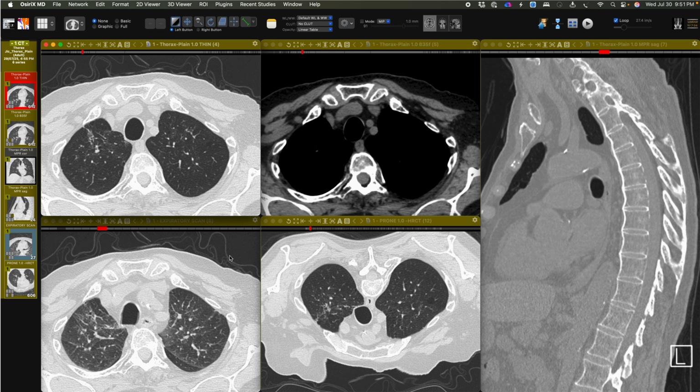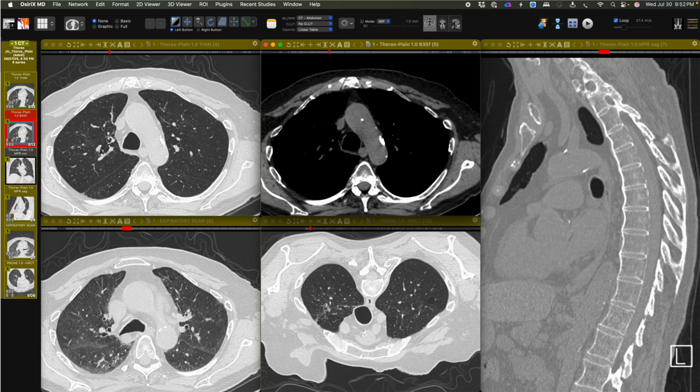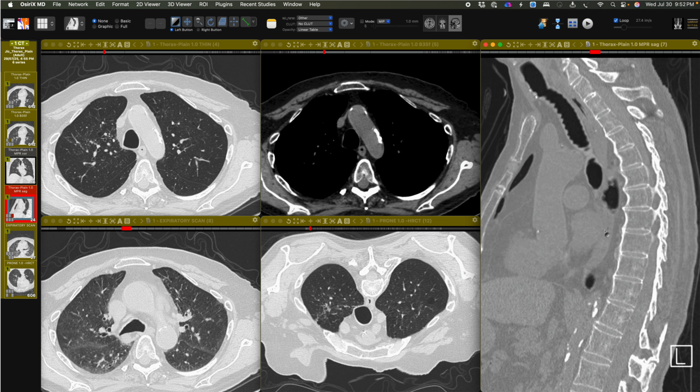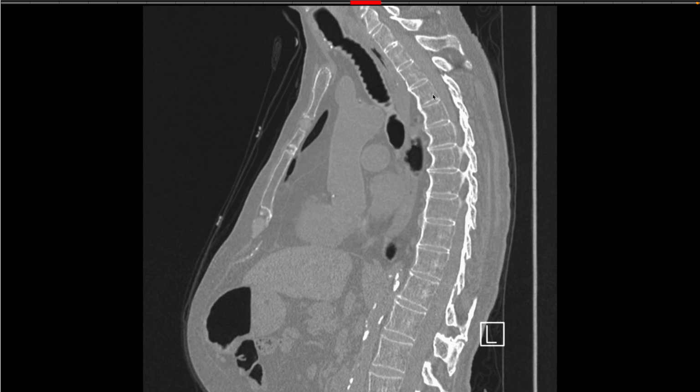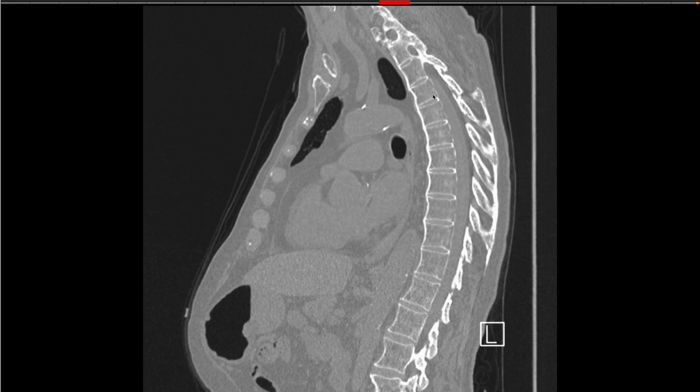And so here is how I open up my scans. You see the volume inspiratory on the left, and you have the soft tissue, then the expiratory, then the prone images, and then the sagittal spine, all of which are opened up together. The sagittal spine shows ALL ossification, also shows interspinous ossification, both of which I'm showing with the cursor here.